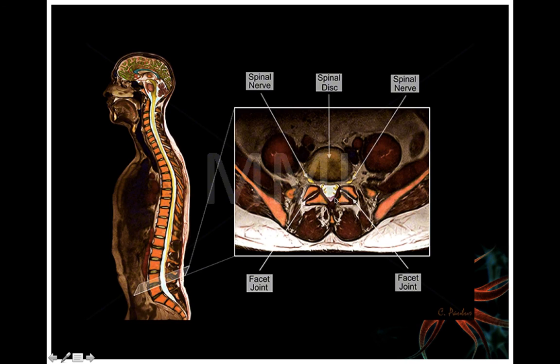It's rather rare for a herniated disc to cause that, because if you look at the spinal canal, it's quite capacious down here. Most of the herniations occur at L5-S1, L4-5, and sometimes up at these levels, simply because most of the flexion and extension occurs at the bottom levels, okay?